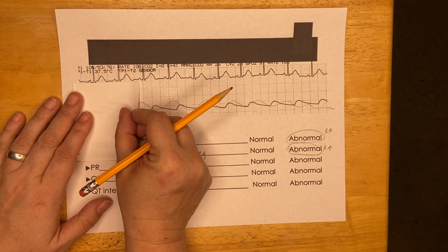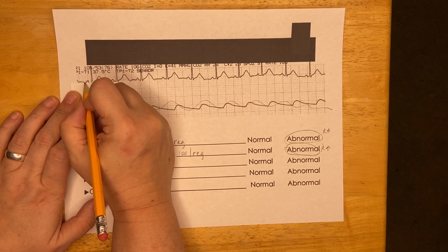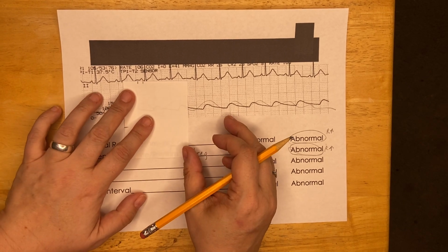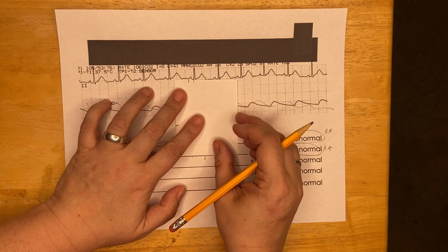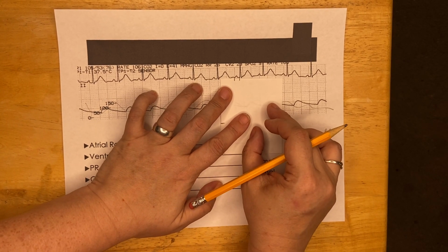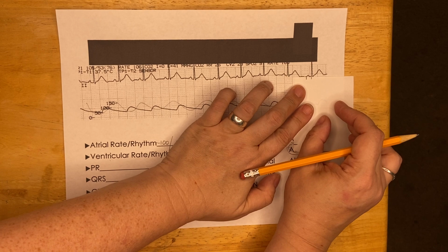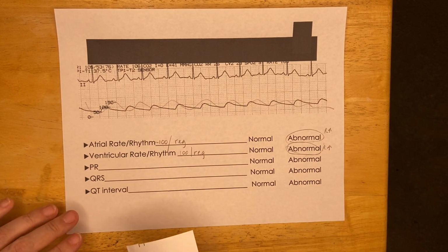I'm going to turn my paper this time, set my paper along the isoelectric line, measure from the P to where the R comes off the baseline. I'm going to take that all the way down the strip. Can you see? In a way, it's almost even easier to see this when you measure with paper because those lines start to line up. And I am seeing the same PR interval, the same beginning of the P to beginning of the R, all the way across that strip.